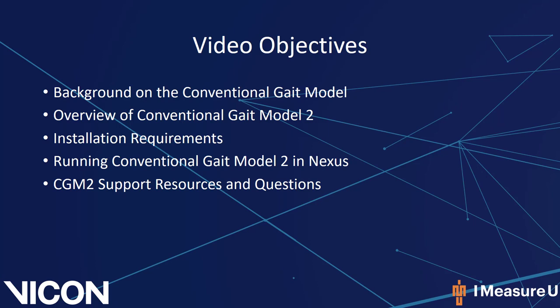Next, we will talk about all the necessary installation requirements. And then I will take you into Nexus, where we will run through a couple of examples. Lastly, we will discuss where you can get CGM2 support resources and where you should go if you should have questions.